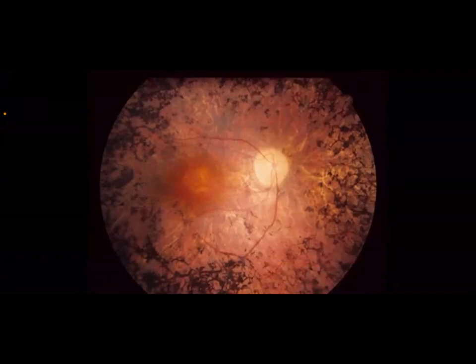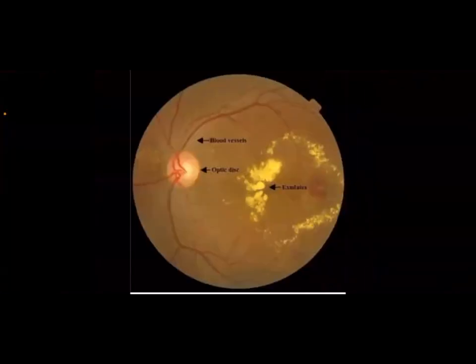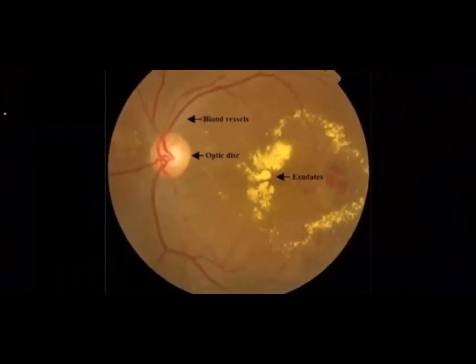Maculopathy. And by the way, maculopathy is very severe regardless of the lesions. Okay, because this is the area which we use to see. This is the most important area for vision. Okay, so this is how it looks. If you can see, it is just like a reflection of light. Okay, and by the way, when you do the ophthalmoscopic examination, you will not see this picture.